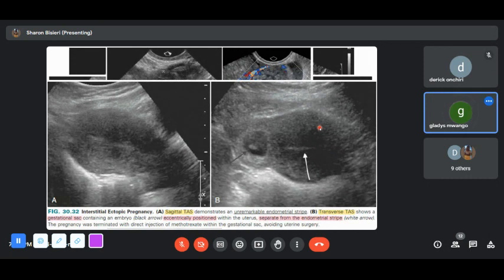Sometimes it can look thin, like in early gestation, which means, if one was following up a patient who had fertility issues, this would be a patient whereby they'll need to really support the endometrium, because she does not have a good secretory phase type of endometrium, because it will not allow for implantation.